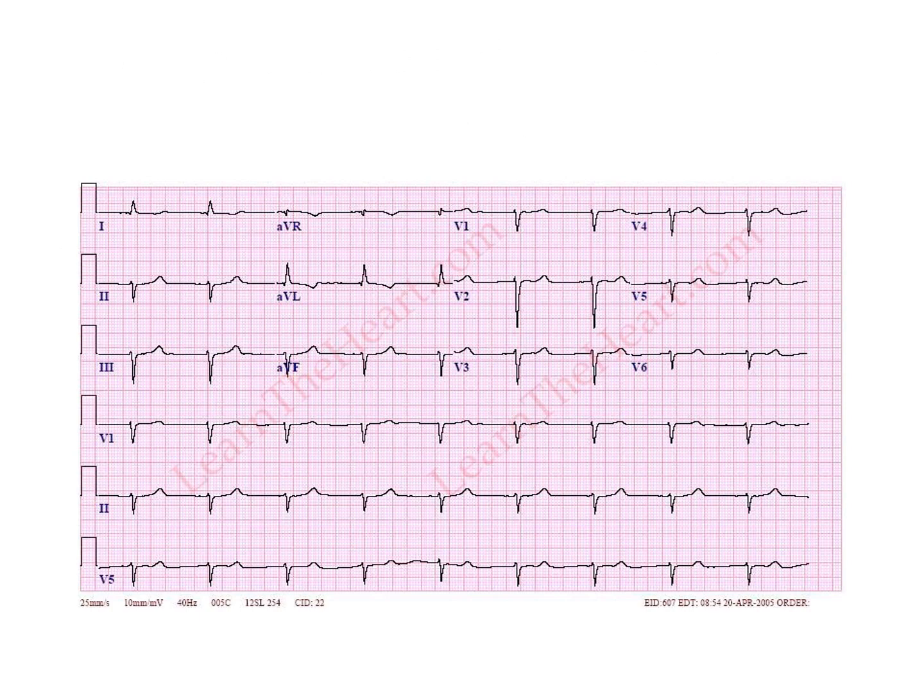Again, going down the conduction system, we're going to leave the SA node and the atria behind, and now we are at the level of the AV node. This produces what's called the junctional rhythms. So AV node, as we mentioned, has 2 jobs. First one is to be the block, the brake in the system that separates the atrial rate from the ventricular rate, but the other role it has is to be the secondary pacemaker if the SA node stops the function properly. So in that case, what will happen is we will still have narrow QRSs.